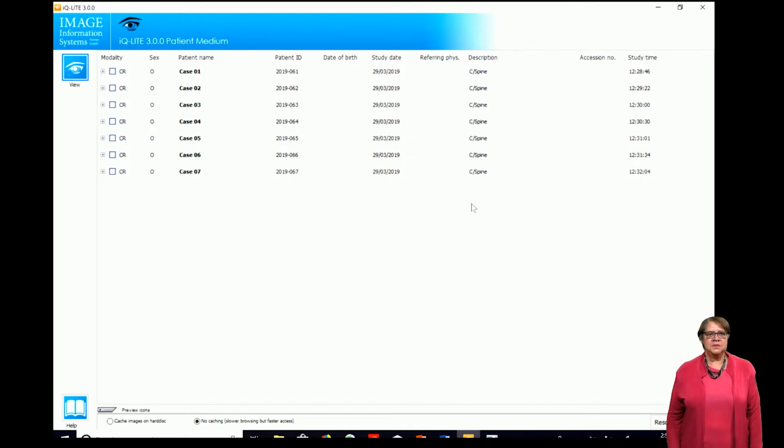Okay, so this presentation is feedback on the practice bank that I've given you on the cervical spine. I hope that you have completed the preliminary image evaluation form. Please keep it at hand as you go through this presentation.